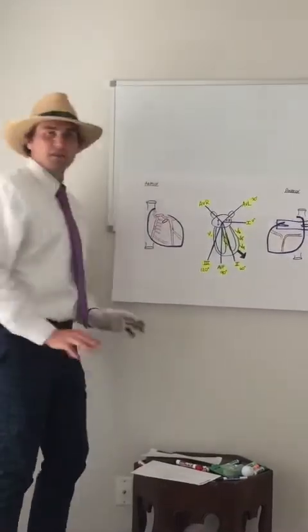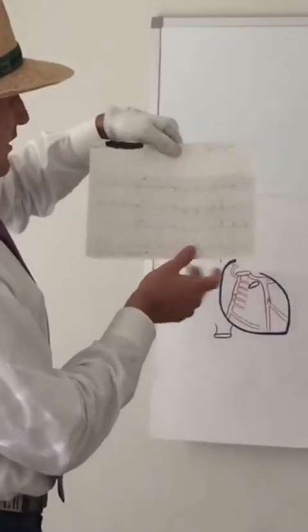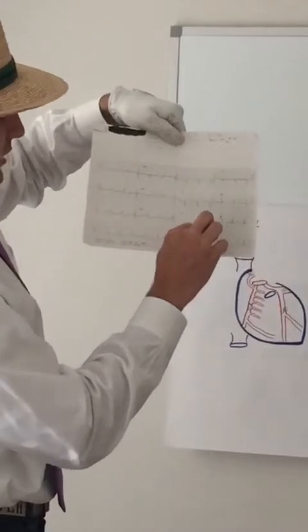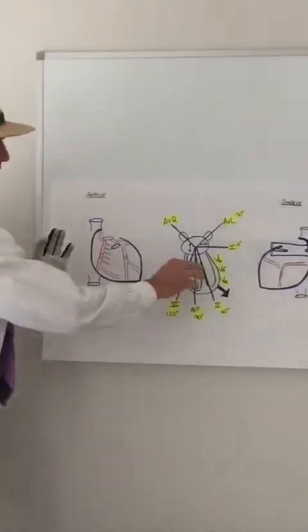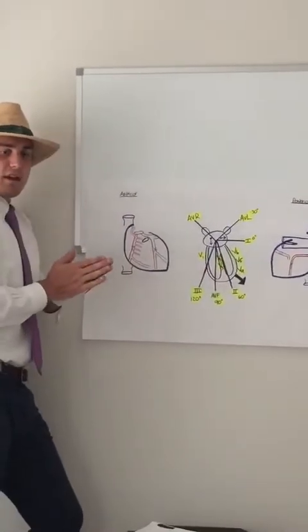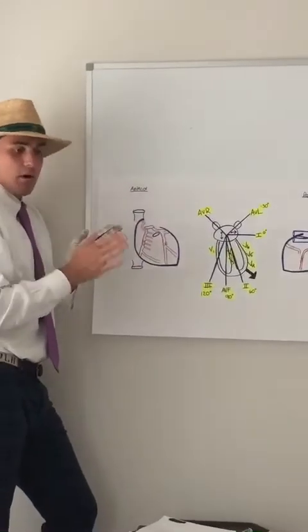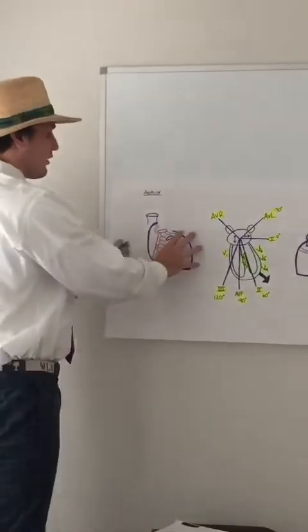Now, let's look at another heart attack. So we're going to come up here, and just trust me that we've got ST elevation here in V2 and V3. When we come over here, we have V2 right here and V3 right here. We know this is an acute anteroseptal infarct. So we come over here, we look at our anatomy.